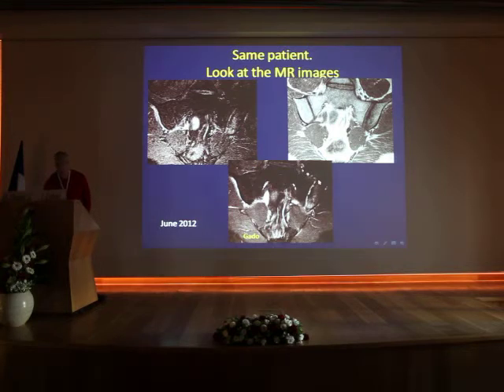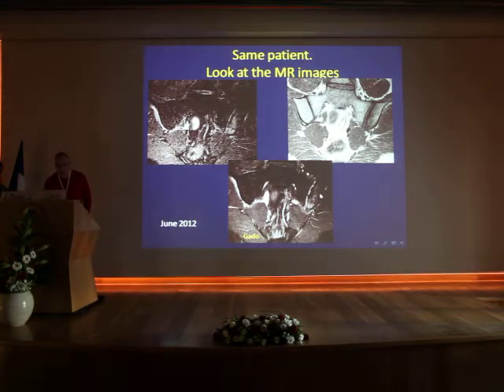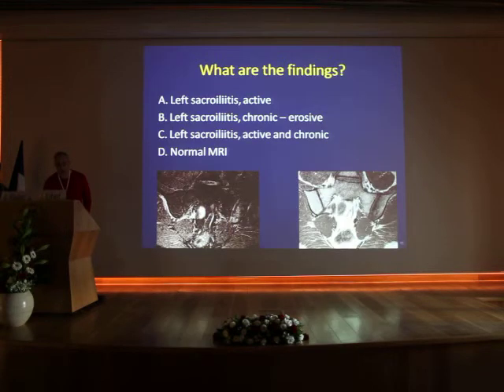Post-gadolinium. Who of you gives gadolinium for sacroiliitis? Usually I do. Yeah. Okay. But you should know that it's not recommended. We do too. It's controversial. It's not controversial. Some do, some don't. Okay. We can see here enhancement within the joint, and we can see here edema surrounding the joint. So what we have here is most likely left side sacroiliitis.